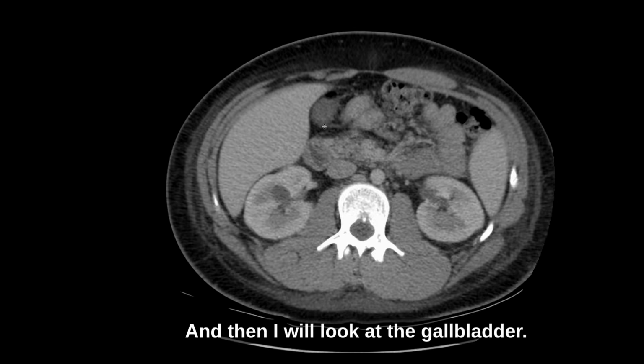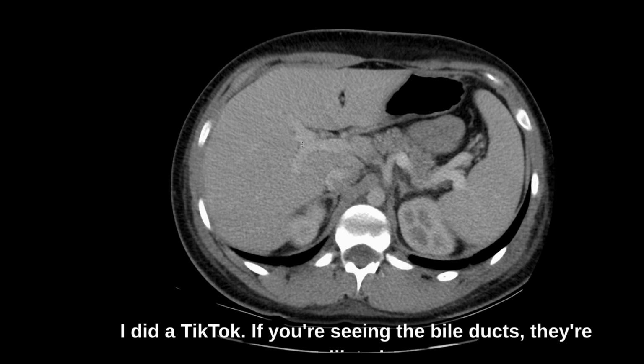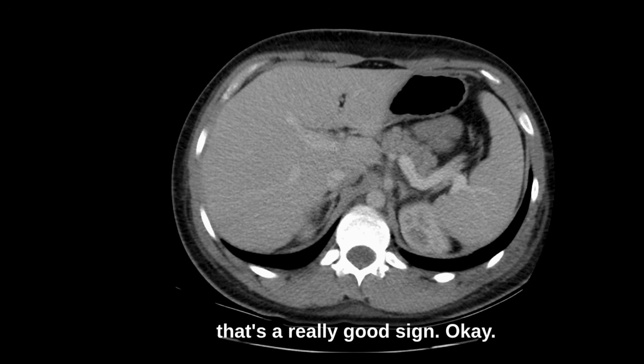And then I will look at the gallbladder: no calcified gallstones, no biliary dilatation. I did a TikTok. If you're seeing the bile ducts, they're dilated. So the fact I'm not seeing the bile ducts, that's a really good sign.